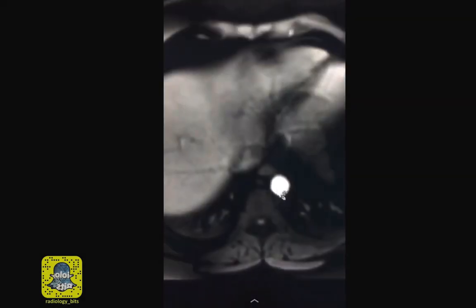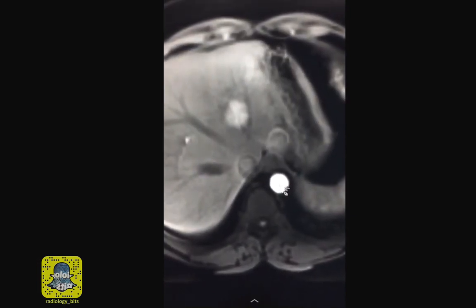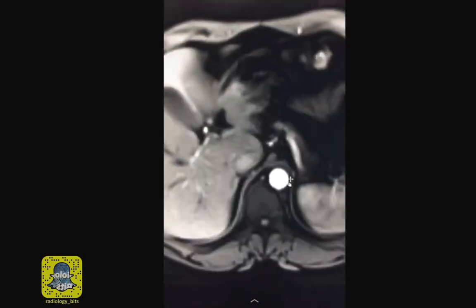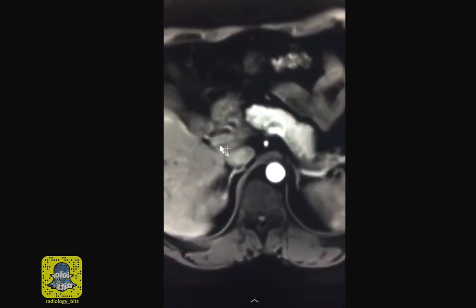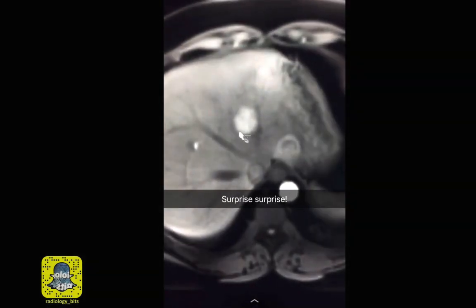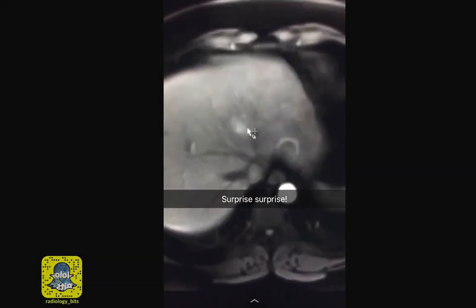Now this is another fat suppressed T1 image after giving contrast, and juniors, you're experts now. You could tell that this is an arterial phase. You know that by the bright enhancing aorta and related branches without enhancement of the venous structures such as the portal vein. And as expected, this lesion is hypervascular and homogeneously enhancing with a well-defined border on this phase.